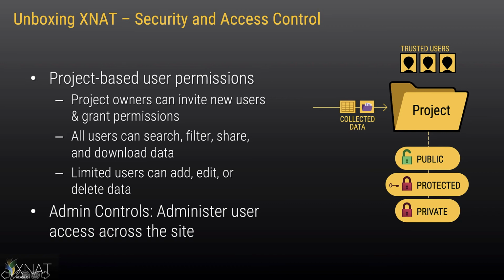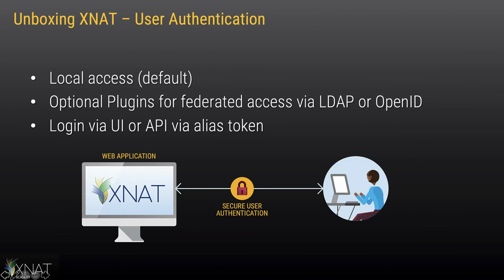Site administrators have access to robust user administration tools across all the projects on the site. XNAT uses Spring Security by default for local authentication and access control, but with additional plugins, you can use an LDAP server or OpenID for authentication as well. Advanced users can also use XNAT's API to generate an alias token to create a valid login session for their external applications.